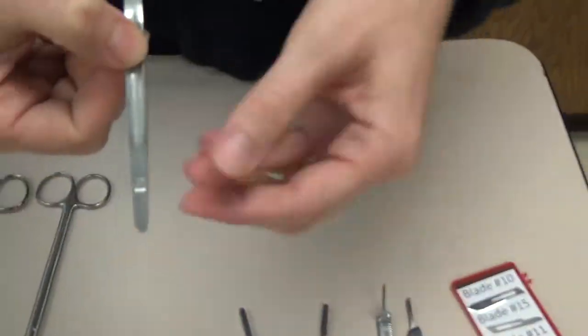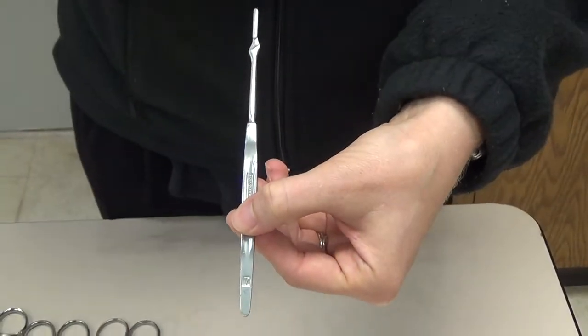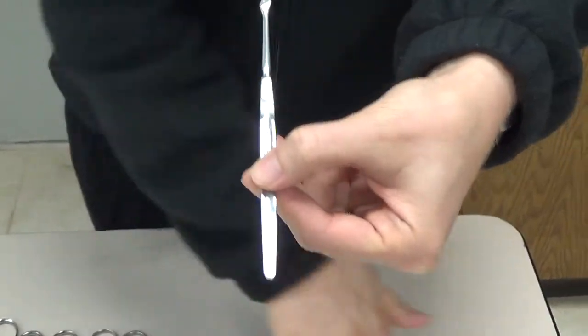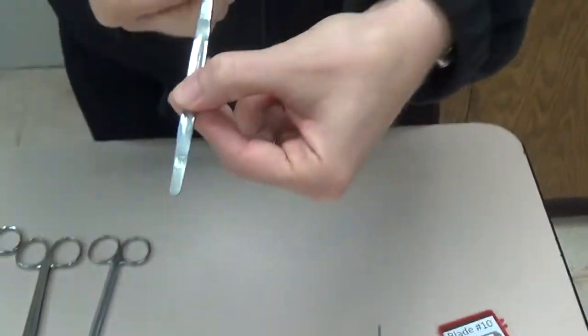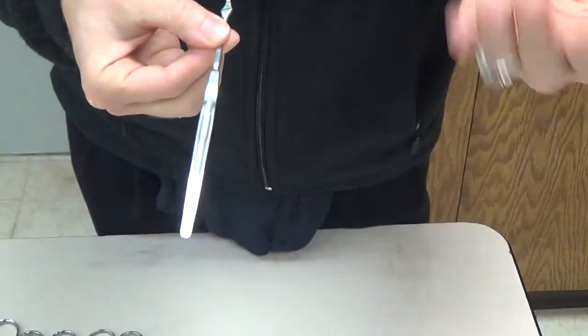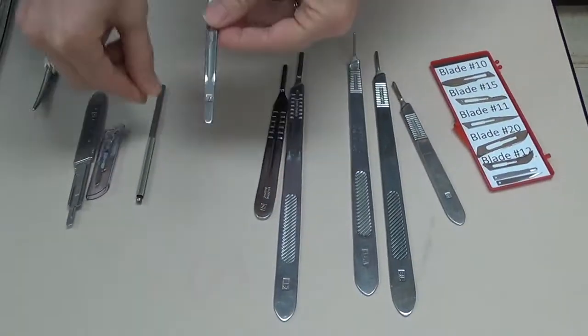We use this for dissecting in narrow cavities, such as in the throat or in the nose or even in the back of the knee, when we're trying to get to areas where these large bulky handles might get in the way. So a number 7 handle might be another handle that you could use depending on the anatomy that you are encountering, and can house the exact same blades as the number 3 does.